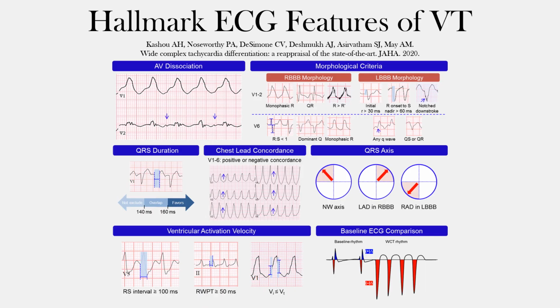In a recently published review in the Journal of the American Heart Association, we revisited the hallmark EKG features of ventricular tachycardia. They are shown in this figure here. I've also placed a link to this article in the comments below, or you can simply search for it to have access to this figure.